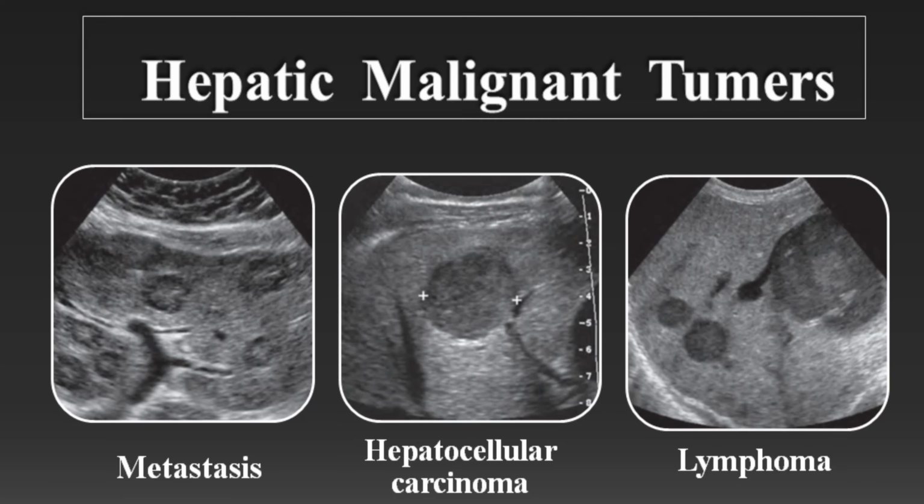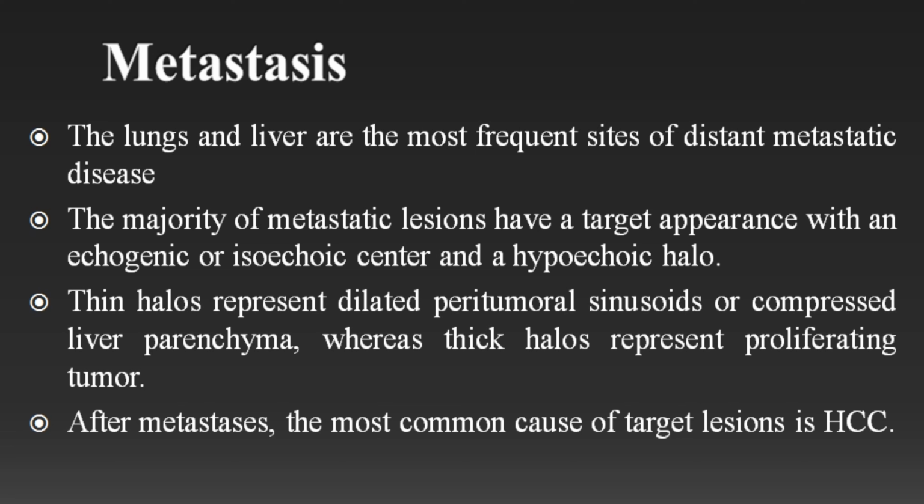Today we are going to discuss the hepatic malignant tumors in different patients. In this topic we will discuss metastasis, hepatocellular carcinoma and lymphoma. Let's start now. First of all, we learn about the sonographic features of metastasis.